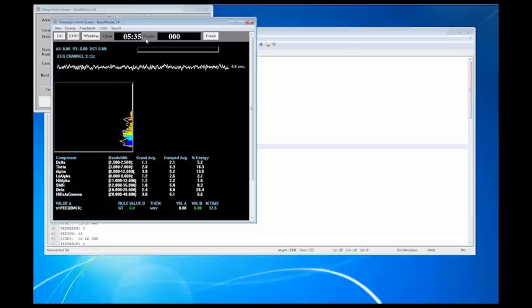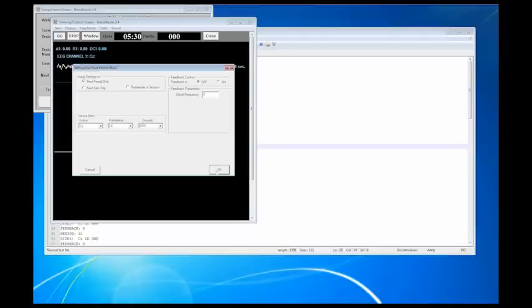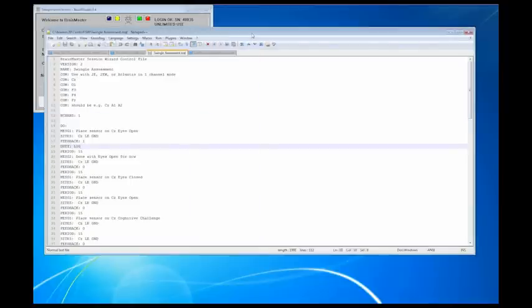If it's on for a brief second, it's only going to work for a brief second if you don't have duty in there. If you have a duty of 25 and you're running for 15 seconds, that's going to probably be about 4 or 3 seconds. So that's how that system kind of works right there.